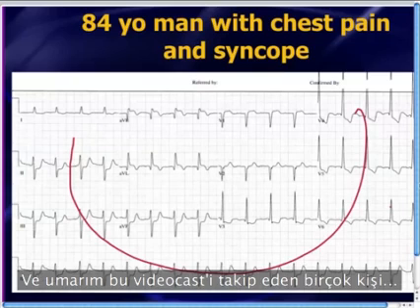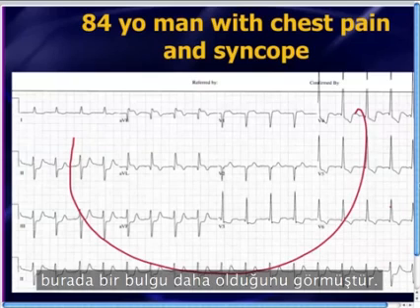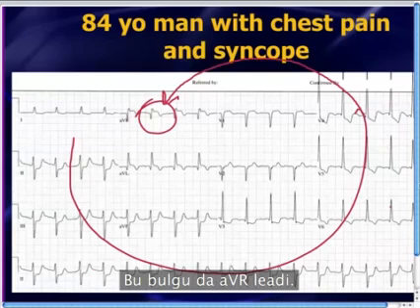And hopefully what a lot of people who have been following this video cast over the course of months and even a year and a half now probably know is that there's one additional thing, that is lead aVR, ST segment elevation in lead aVR.